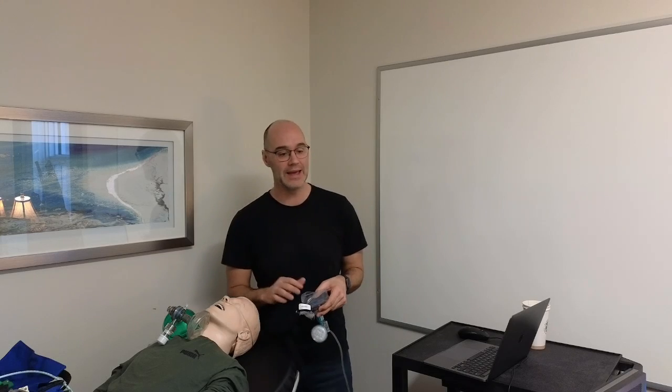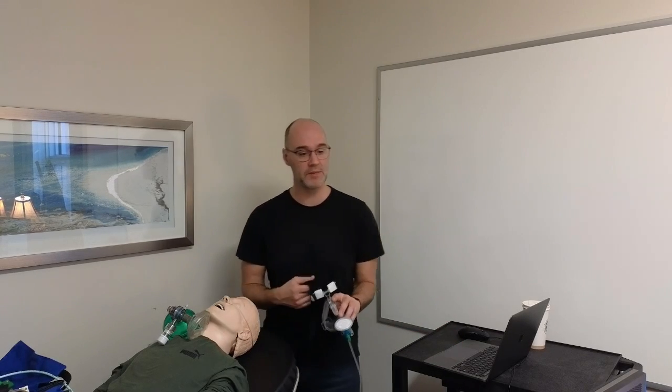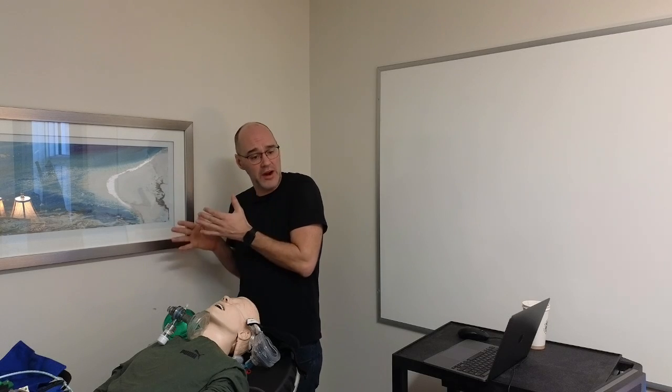So CPAP can splint airways open, both big and small, as you think through that. Now, the difference between CPAP and PEEP. This is a confusing topic because of these terms. CPAP is continuous positive airway pressure, whereas PEEP just speaks to the positive end-expiratory pressure. So it's just during the exhalation period and during that respiratory pause that PEEP is being applied.